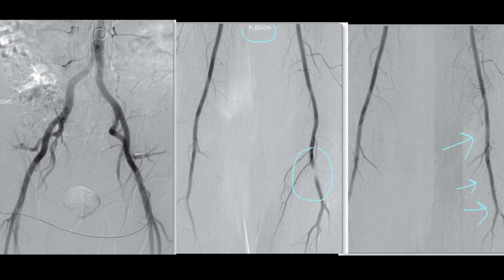To further evaluate this finding, it would be beneficial to review imaging of the runoff vessels to assess for any distal disease. Additionally, correlating these imaging findings with the patient's clinical presentation is crucial. On the basis of these angiographic images, I'm considering the diagnosis of left popliteal artery entrapment syndrome. This is a condition where an abnormal relationship between the popliteal artery and surrounding muscle or fibrous structures leads to arterial compression, particularly during certain leg movements.